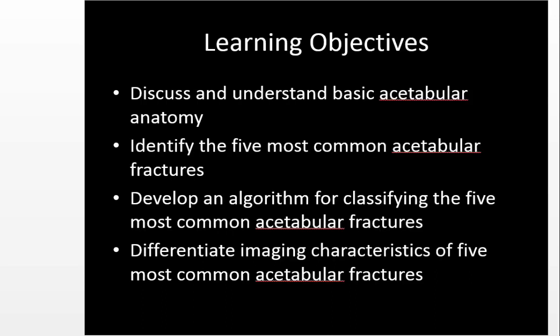Okay, so what I hope to do today is discuss and understand basic acetabular anatomy. We're going to review the most important parts of the acetabular anatomy to understand acetabular fractures. Identify the 5 most common types of acetabular fractures that you're likely to encounter in your practice. Develop an algorithm for classifying those 5 common acetabular fractures, and then differentiate these 5 acetabular fractures based on imaging characteristics.